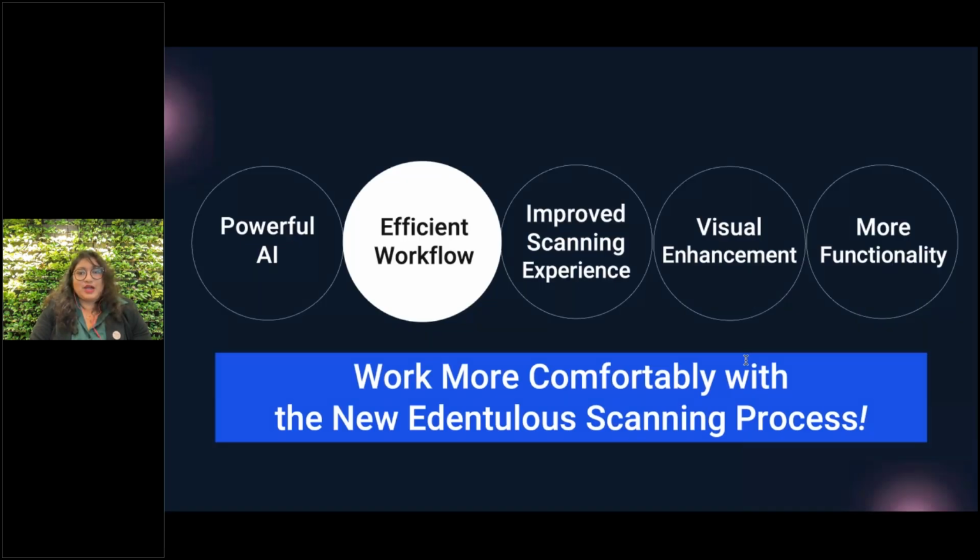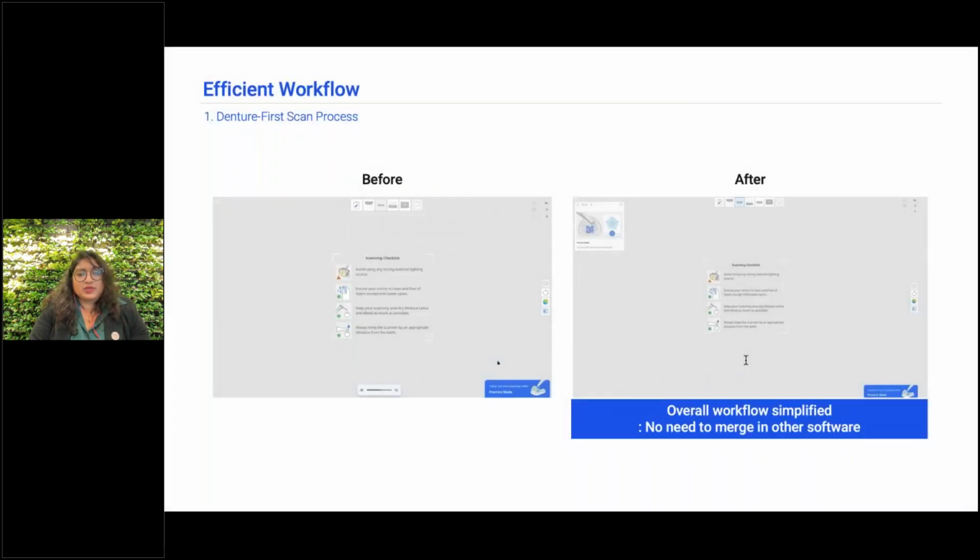All right, so now moving on, the next key point is the efficient workflow. In this section, we are going to show how you can work more comfortably with the new edentulous scanning process. In the edentulous process, starting from the denture scan was not possible before, but it's possible now in the new software version. And I'm going to explain what it means a little bit more.